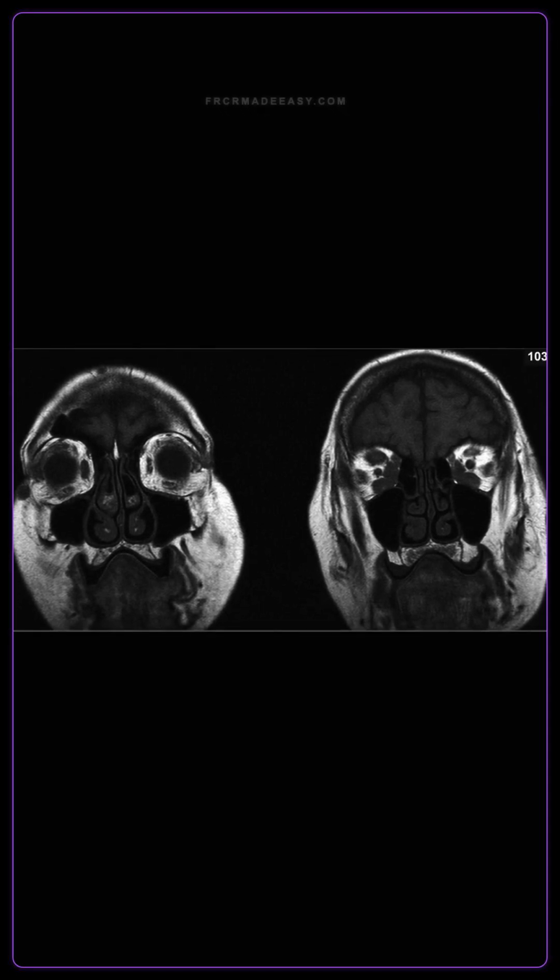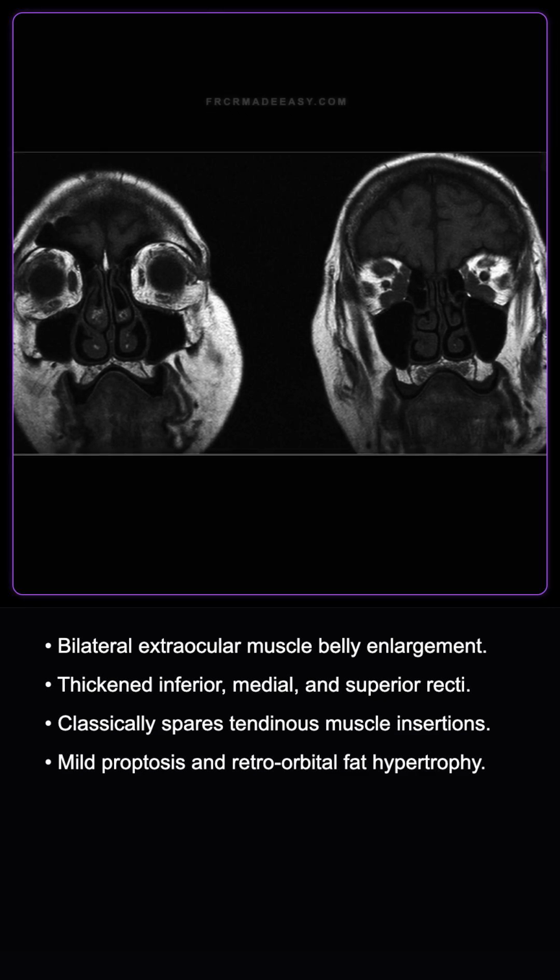A 35-year-old male presented with diplopia. I am showing you a coronal T1 weighted orbital MRI scan. Describe the findings. Okay, assessing the provided imaging.